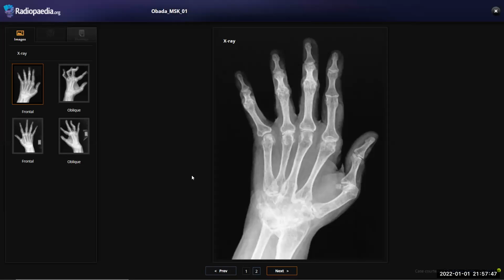Okay. Thank you. So this case was fine about detecting rheumatoid arthritis. It's the carpal bone fusion and this periarticular osteopenia, and the Boutonniere deformity you got quickly. When it's a simple case like this, I think the examiner would further question you about knowledge more in these cases. Like SLE doesn't have erosions, and you will not find fusion like this. But you did very well about the psoriatic arthritis, which is more distal than this. So in general, very good.